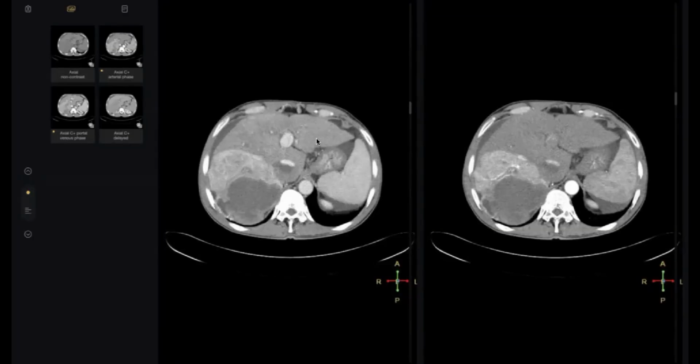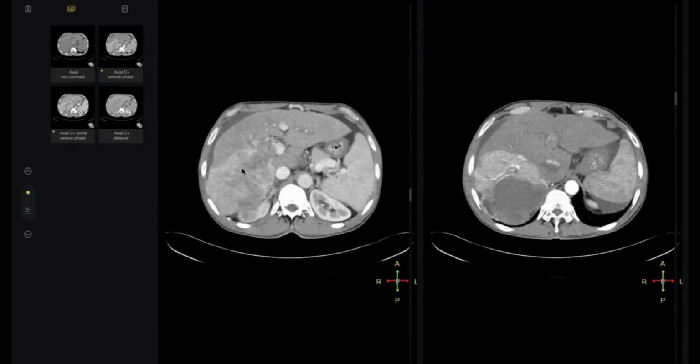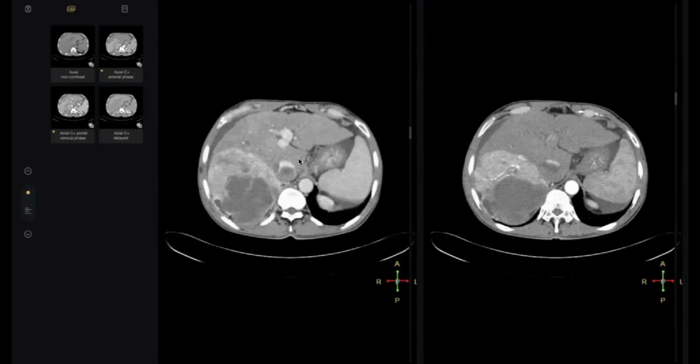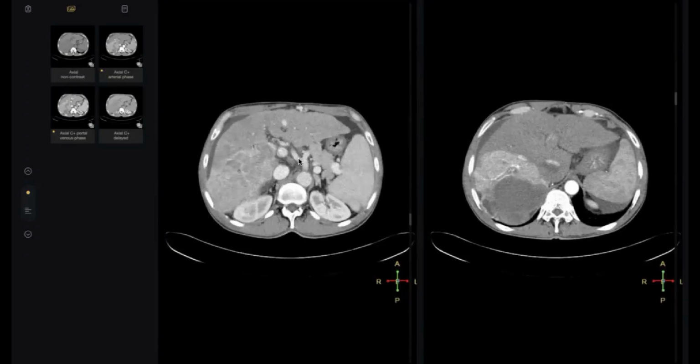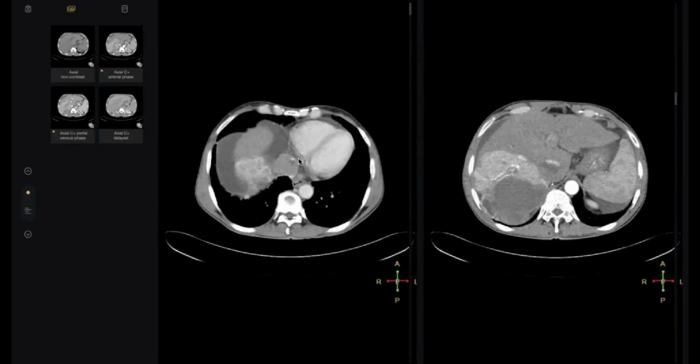This is another case. See, I didn't speak about LI-RADS itself, but about the dangerous sign. If a case like this presented to you in the Viva and you didn't talk about how dangerous or how critical the invasion of this mass to the vessel is, be sure that the examiner will be unhappy. If you wanted to add more information, it may be LI-RADS tumor in vein, he will be so happy. The classification here, LI-RADS TIV, tumor in vein, is the worst classification in LI-RADS.